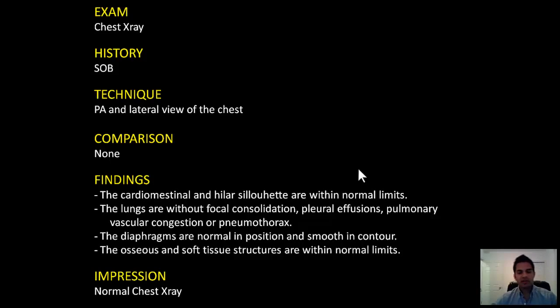So hopefully this helps give you a search pattern that you can practice, and hopefully not miss findings when they come up. Again, it takes a lot of experience to actually, once you make a finding, explain what that finding is.